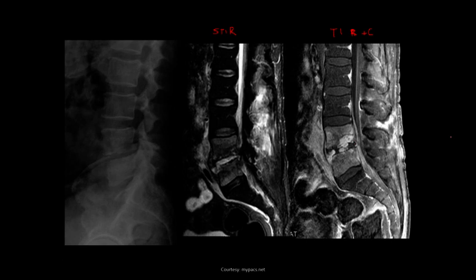Regardless, spondylodiscitis, pretty easy one. So again, big things for spondylodiscitis, what we're looking for is body destruction, end plate destruction, and disc loss. So if you see those in combination, the end plates and disc and or body being destroyed, that is a pretty much slam dunk for a spondylodiscitis.